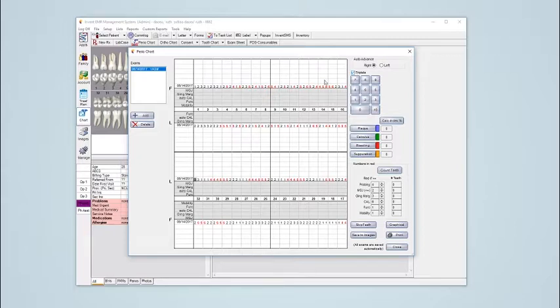Some people like to go the other way around. So as I press on the keyboard the numbers, the reading will advance to the left. I can do it the other way around by clicking on the right icon there, and there we go. It will do the update as I go there, but I prefer the left hand side direction. Okay, so what we did now is that we added all the probing numbering.